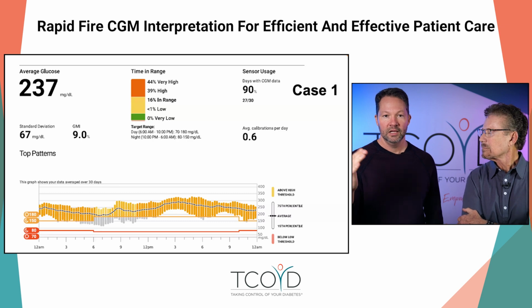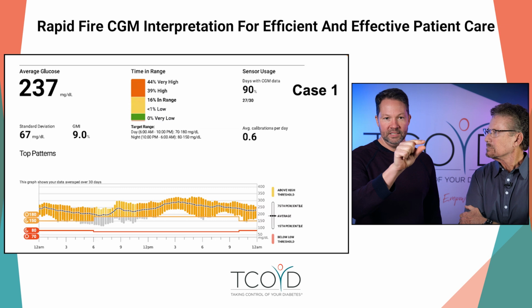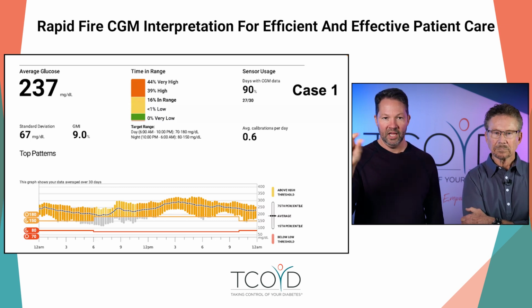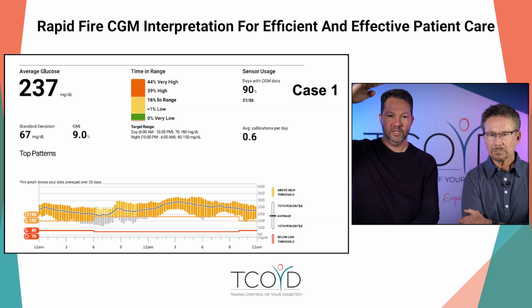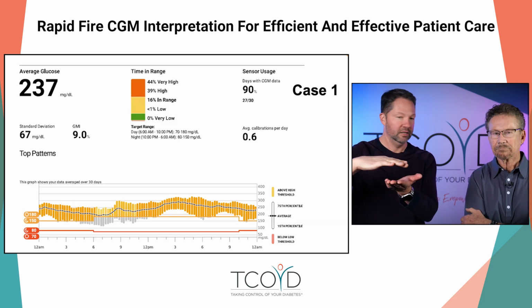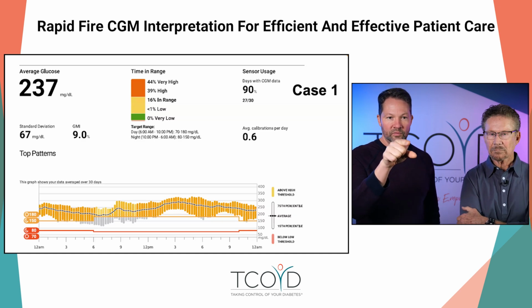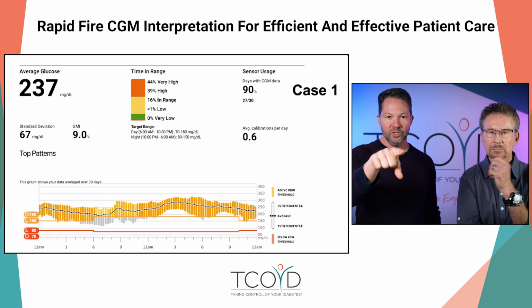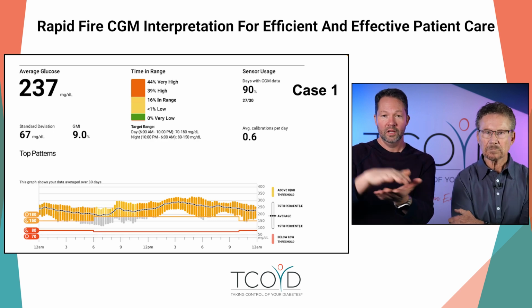And then you go down to this 24-hour period, which we didn't describe in detail, but that dotted black line is the average blood sugar for that time of day. And the bars around the dotted line are the fluctuations around that time. So the bigger the bars, the more fluctuation. And a little caveat here, that the Dexcom download, for whatever reason, can default to putting the time in range goal between 80 and 150 overnight. Do you see that? Yeah. So you would want to make sure that's actually set to 70 to 180 all day long, just for all of your downloads.